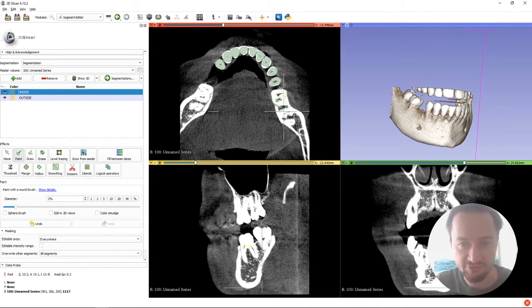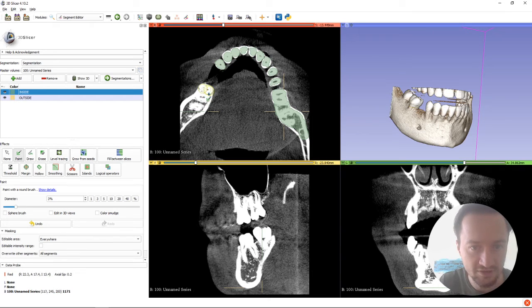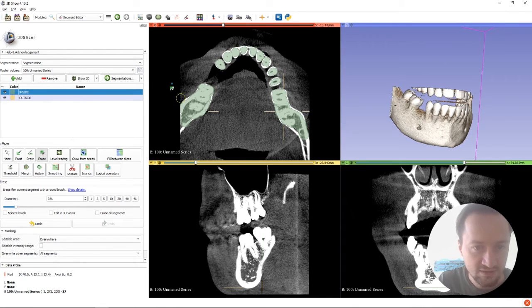So if I then go back to the 3, that then allows me to have much wider brush strokes and choose the segmentation for what I'm working on. There we go, and then on these teeth over here, nice and easy, just a nice big brush, select what we want. Again, I've gone slightly out, so now I'm just going to choose that erase button and just make sure I've not taken any of that extra darker grey with me. There we go.